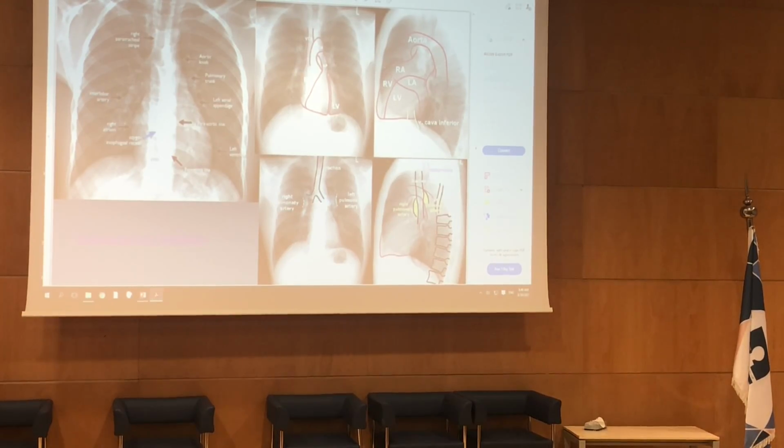And you know that by X-ray, sometimes you need to diagnose which cardiac chamber is enlarged, especially in the pediatric group, because then you can reach the diagnosis of what kind of congenital heart abnormality this patient has. That's why it is very important that you know which portion of the heart is actually protruding. The posterior aspect on the lateral view is formed by the left atrium and part of the left ventricle.